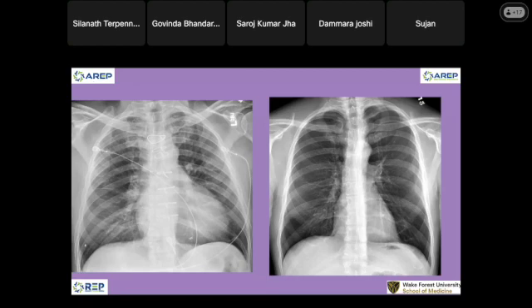So there is a pneumothorax. I think so. Pneumothorax. Okay, pneumothorax. Are you thinking here or here or where? No pneumothorax, so this one. Okay, right upper zone. The internet is a little bit slow. I cannot hear you. Please repeat that to me. Okay. All right. Besides big heart, probably calcified hilar nodes here on the left. Okay. And doesn't look like anything much.